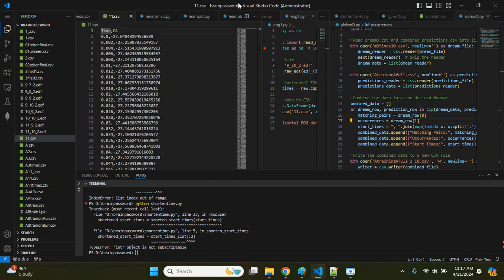I created this a couple days ago. This is just a visual project I wanted to work on to visualize the data differently. This is not the full model visualization that I've been showing for like a month now, but this is just the data in a new visualization.